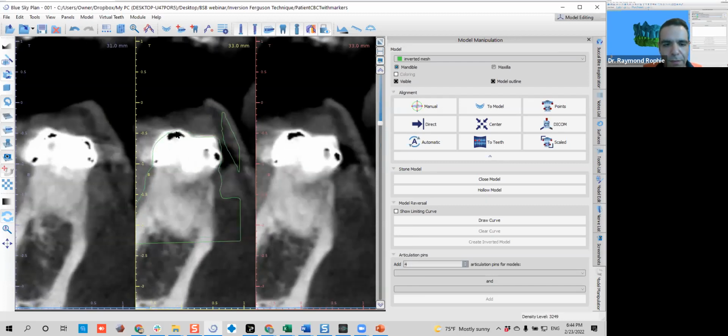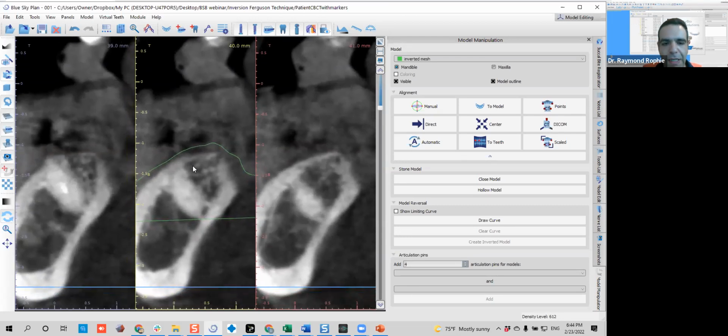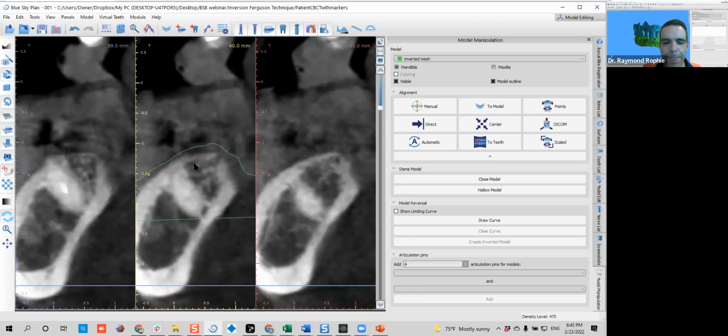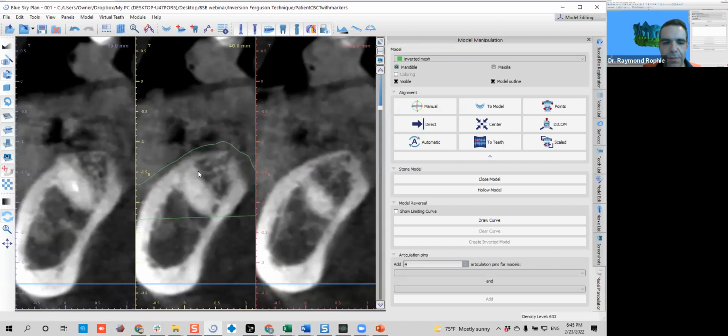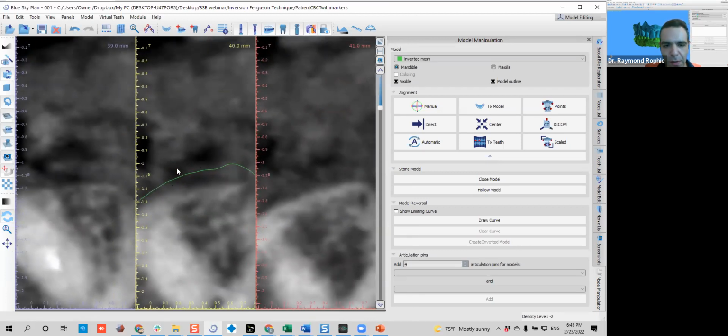So once you have checked all the area and you are on the edentulous areas, when you know what to look for, it is actually one very powerful tool to know if this is aligned or not. Okay, so here you can see actually the radiopaque tissue, then radiolucent space, then radiopaque more.